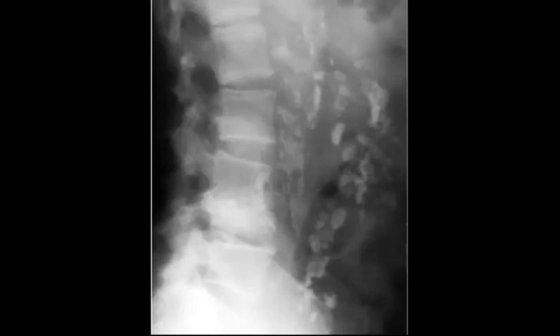After you finish your checklist, you will find that the title will be paraspinal calcifications, and some of them like psoas collection or abscesses calcified, plus the joint space affection and the destruction of this vertebra. So most probably it will be TB spondylitis or Pott's disease.